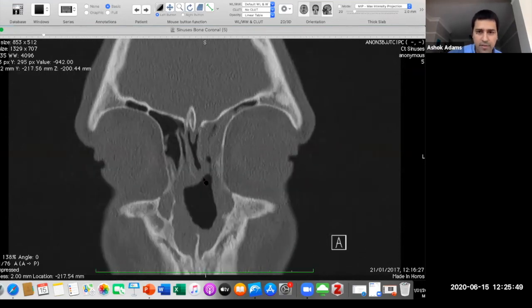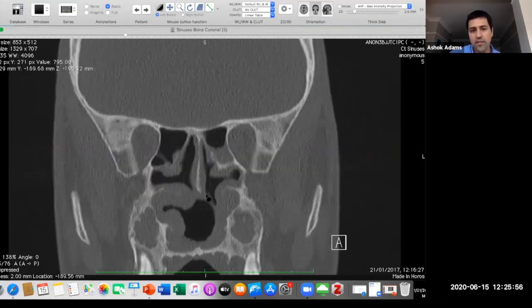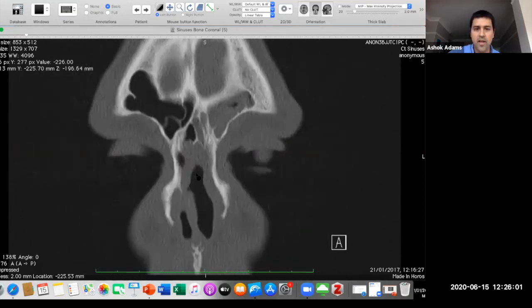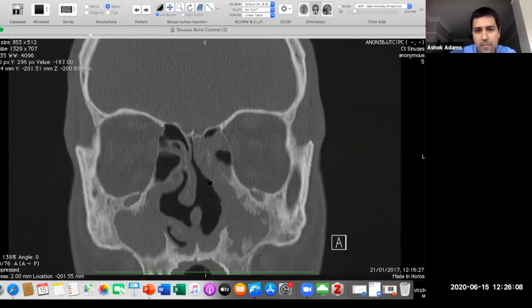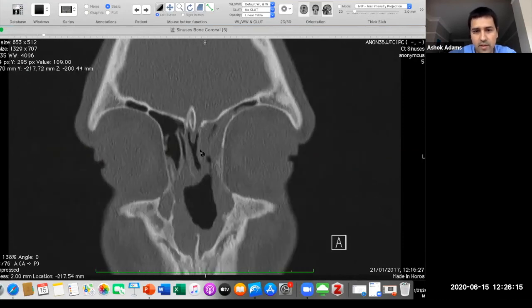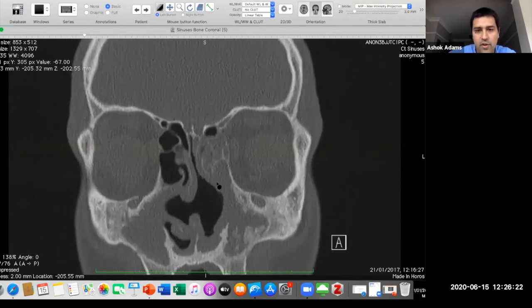So the way I'd report this is to comment that there's an aggressive sinonasal process. The differential would be: you'd want to know if there's any history of illicit drug use, cocaine snorting, anything like that. You'd want to know if there's a background history of a granulomatous process, such as sarcoid, or other vasculitis, so there are ANCA-mediated vasculitides that can cause this pattern. This patient had a proven vasculitis, and you can see how you'd flag that up there. You've got a middle turbinate, and you can't see it on the other side.